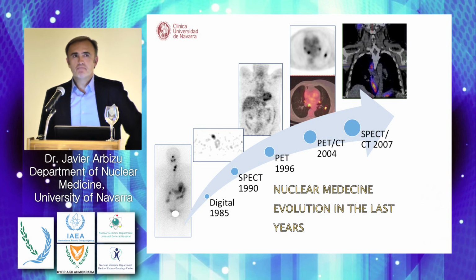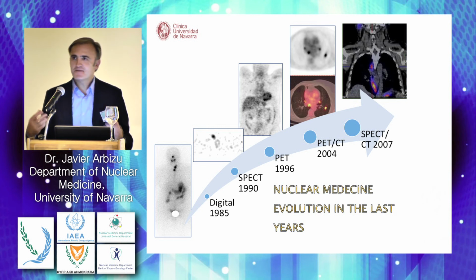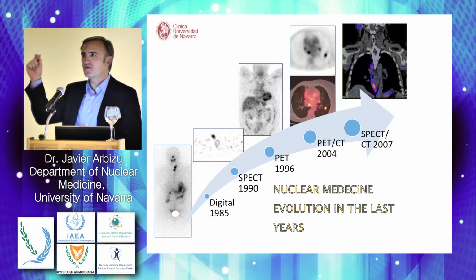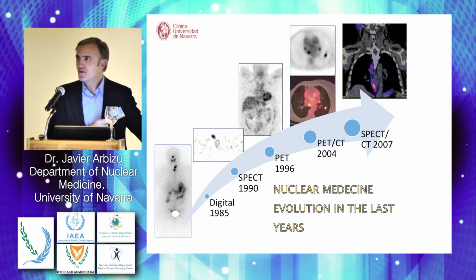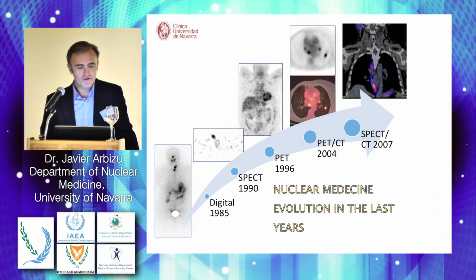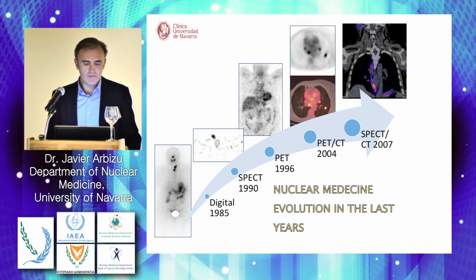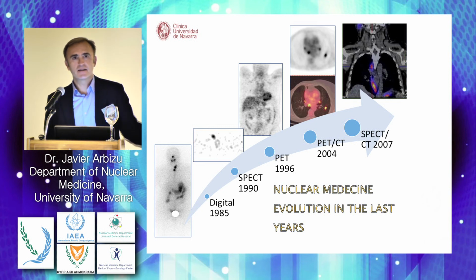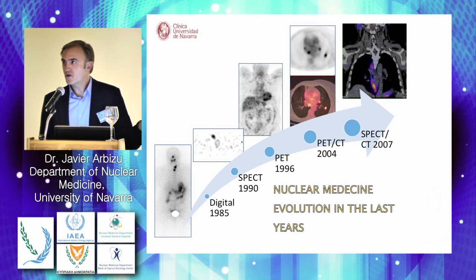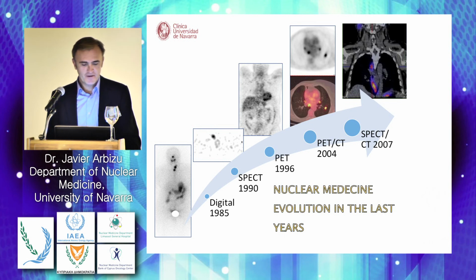images. Most of the young people who are here didn't realize this, but when we started using nuclear medicine, we were using plaques instead of computers. So this is an evolution from my point of view. We can look at the image in the computer, and then we can avoid, for example, these areas of high activity, which was not possible in the past, or required just some devices.